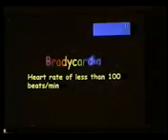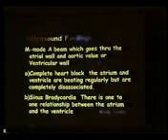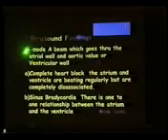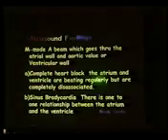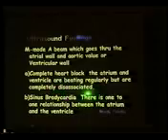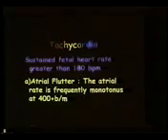Now, what is bradycardia? Bradycardia is a heart rate of less than 100 beats per minute. In ultrasound we can do it with M-mode, with the beam going through the atrial wall and the ventricular wall or valve. Complete heart block: the atrium and the ventricles are beating regularly but are completely dissociated. This is what we do in M-mode. Sinus bradycardia: there is a one-to-one relationship between the atrium and the ventricle. So this is what we talk about in bradycardia.